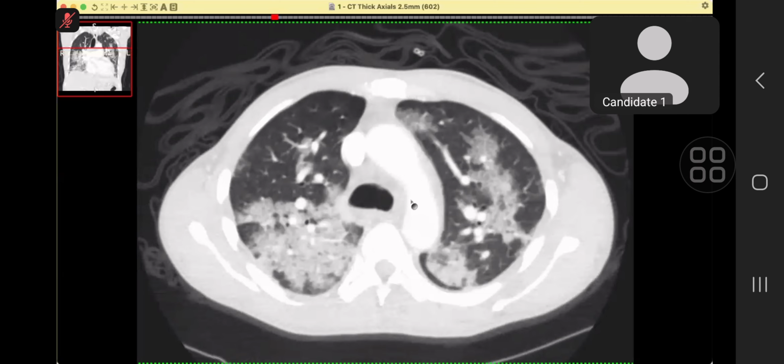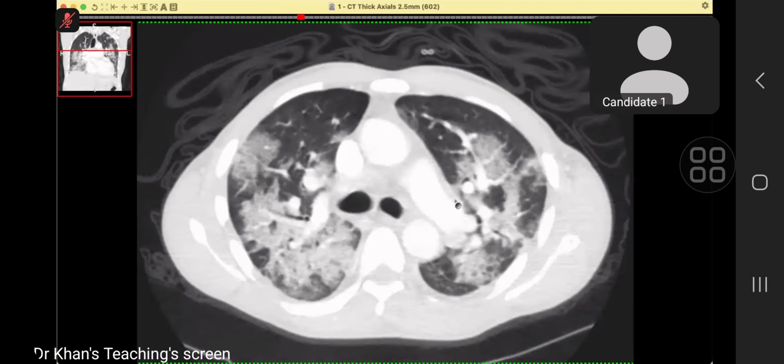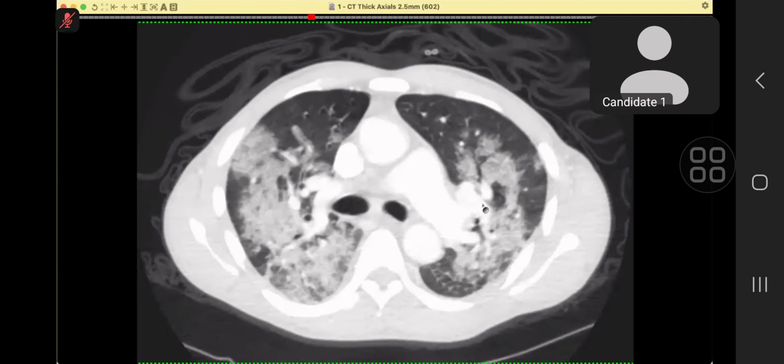So I will inform the finding again, will suggest referral to the cardiologist for further management. Also, I will suggest echocardiography after stabilization of the patient. This patient needs a course of diuretics and follow-up imaging.